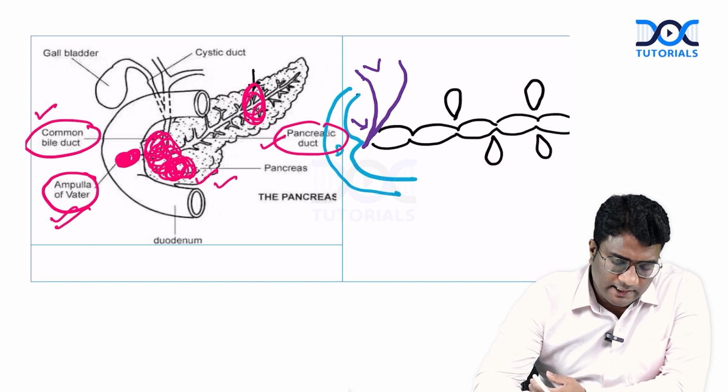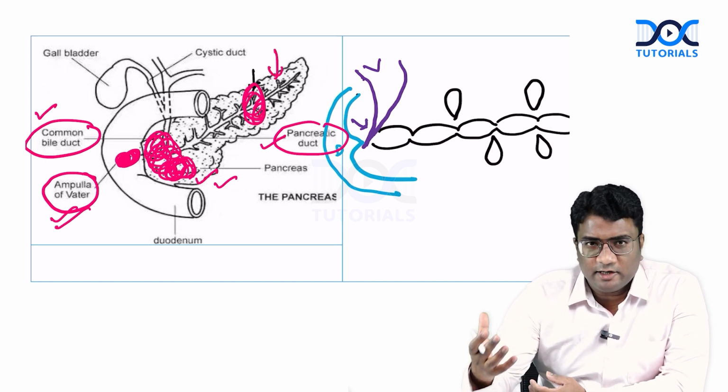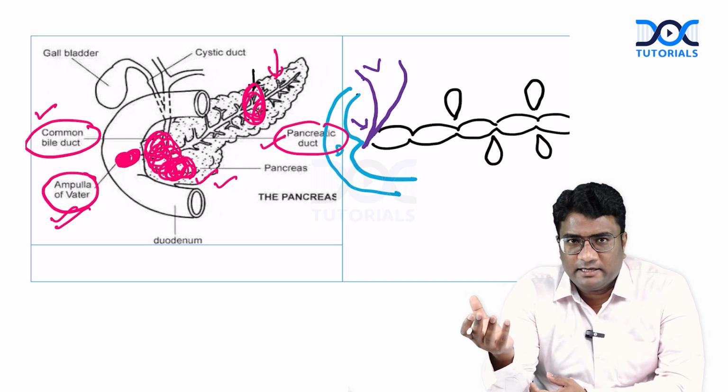If it is in the body and tail of the pancreas, only the distal pancreatic duct will dilate, not the CBD.